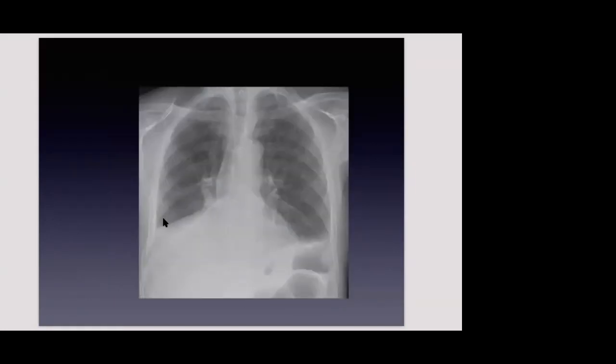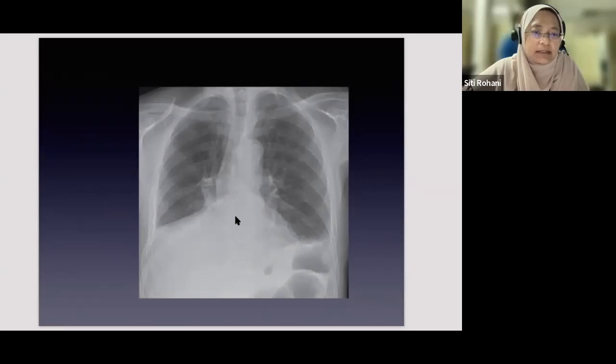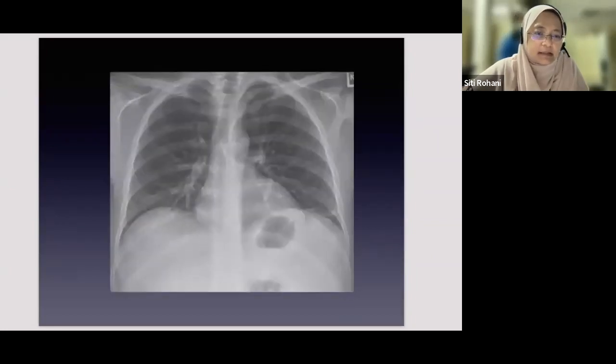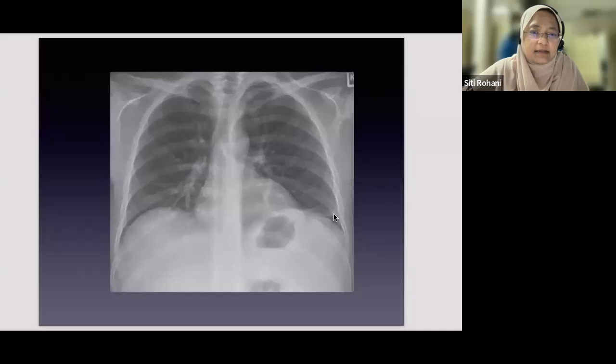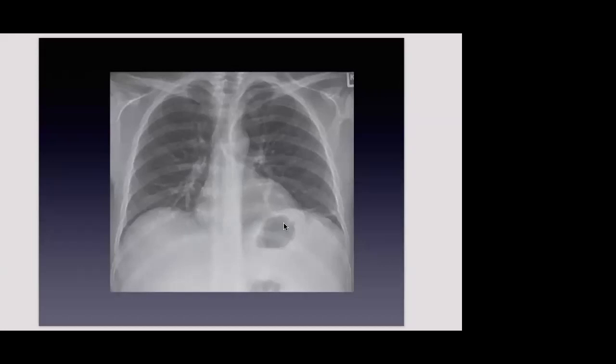This is both. The two pathologies coexist, right middle lobe and right lower lobe collapse. The right hemidiaphragm is obscured, the right heart border is also obscured. Evidence of volume loss in the right lung. And this is my last X-ray for this part of the presentation. There's plate atelectasis in the left lower lobe here. There's not much volume loss.